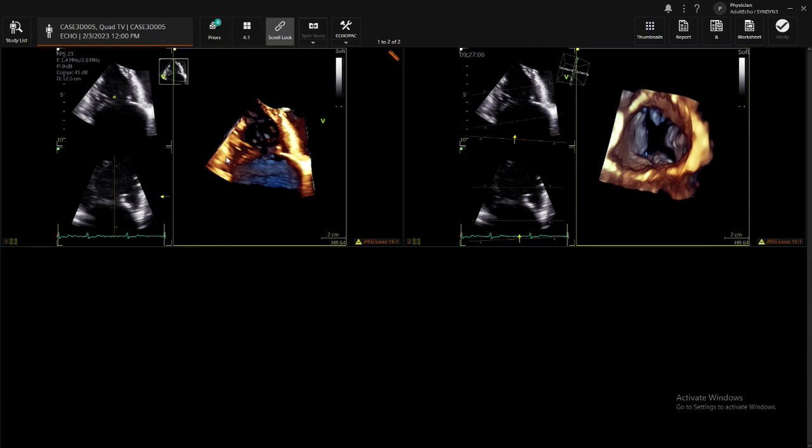And that's just based on the fact that the tricuspid valve is kind of a more anterior structure. And so with a transthoracic ultrasound probe, we have different imaging windows where we might be able to visualize it very nicely and have the probe close to the valve. Transesophageal echo, the tricuspid valve tends to be far away, so sometimes our images aren't as good.